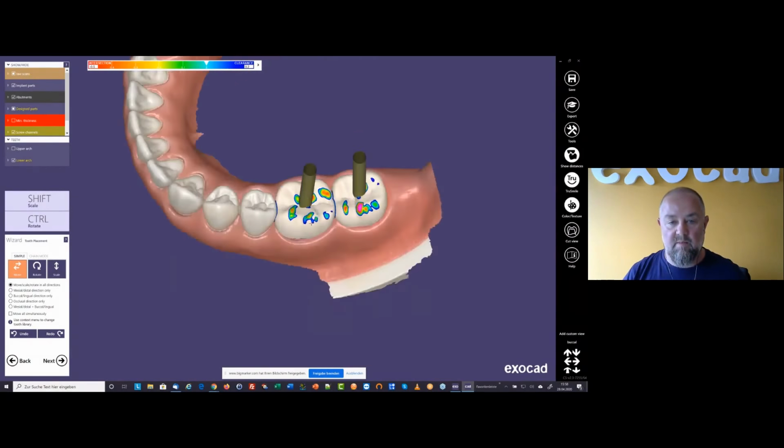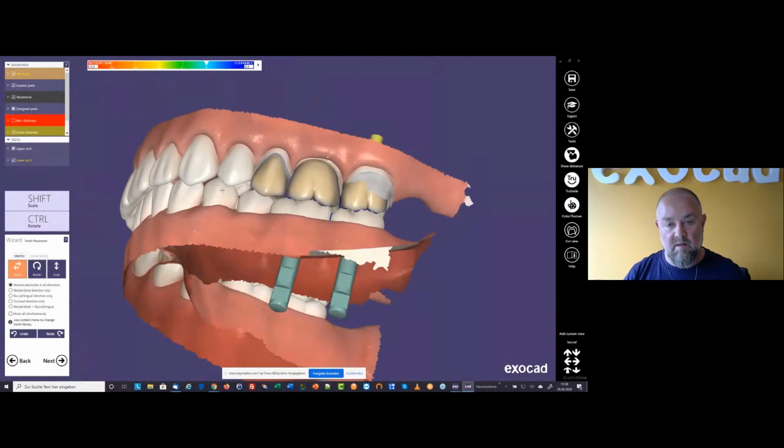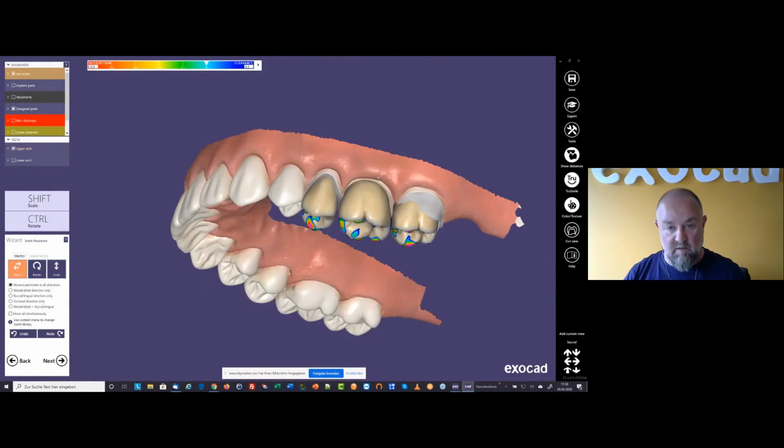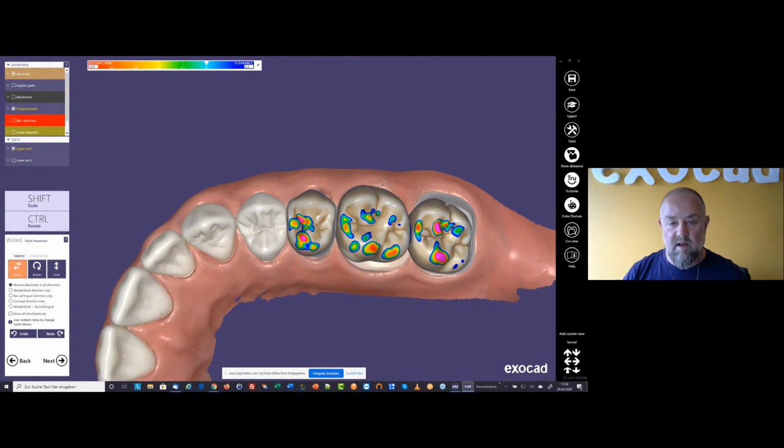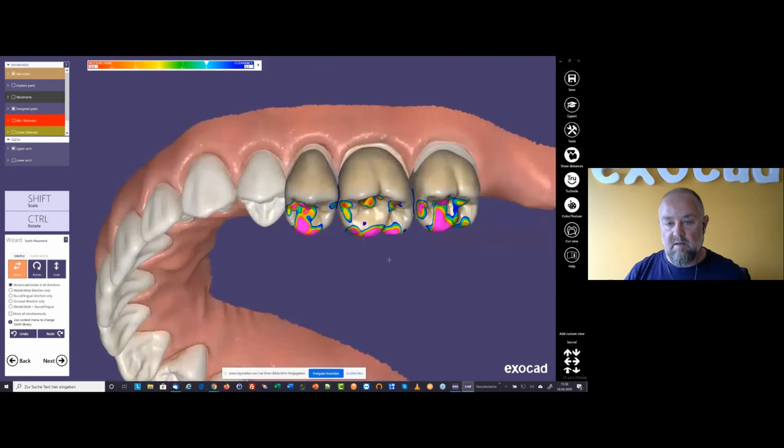Yeah, like that. And then I show again the upper jaw, or hide even the lower jaw, and I see my library teeth are maybe too small. Then first I scale the teeth a little bit here and place them approximately in the area of the preparation, like that.